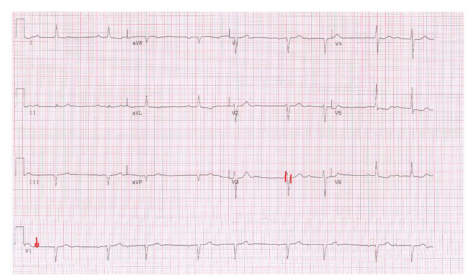And then all the way over here, here's another P wave. I'm going to mark that. And then my QRS complex and T, and here's another P wave right here. QRS complex and T, and here's a P wave, and P wave, and P wave, and P wave. So once I've marched those out, what I'm noticing is that I have a rhythm that's also regularly irregular.